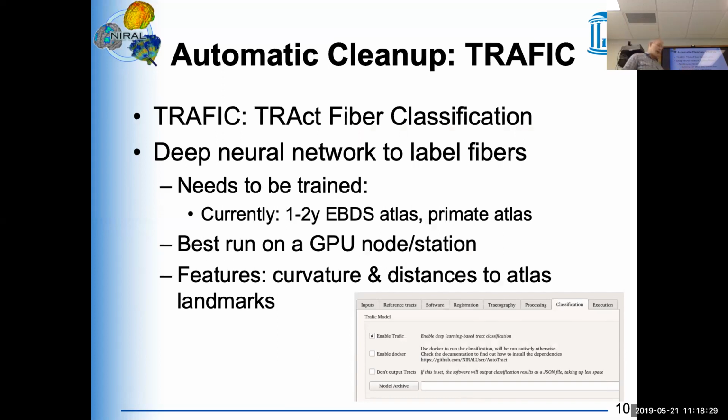And then once you get this optimistic tractography, the next and last step is to do a classification. Basically, it classifies each fiber whether it belongs to a certain tract or not, or it labels a fiber with a tract name. Think of it like that. Now, of course, in order to do that, we have to already have a prior trained algorithm.